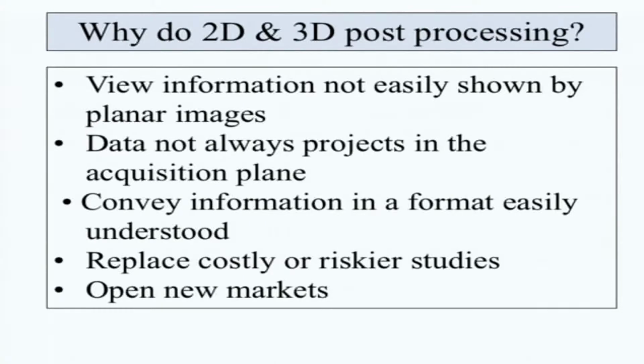And generally, when we are taking the CT, the planes that are taken may not be the actual plane in which you want the images, such as for the scapula and all. So you may not get the planes in which you actually want. That thing again can be done very easily when you process these images, and it conveys the information in a format very easily understood, and it may sometimes replace costly and riskier studies. We will come to that, and again it can open new markets that we are going to see in the subsequent part of the course.